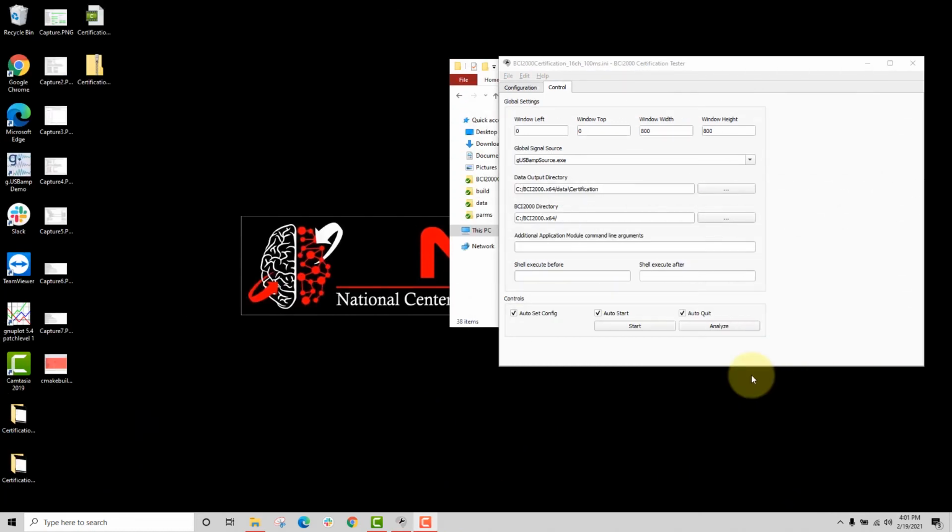So once our BCI2000 certification tester has finished running through the 60 certification tests that we wanted to perform, we can actually analyze these results to determine the various latencies for our video stimulus presentation, our audio stimulus presentation, and the latency across the analog to digital converter.